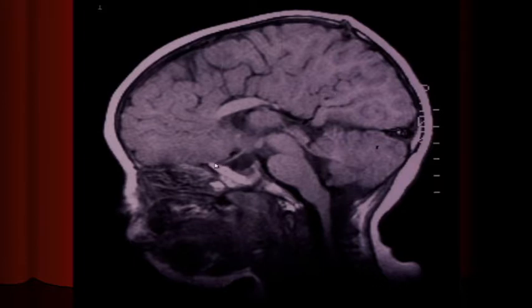The optic nerve. The nerve is from here, and then when it gets behind the chiasm it is the tract. Very good. And what is this right here? The massa intermedia, or the interthalamic adhesion. When you're midline, the thalami are all off midline. This is the massa intermedia, or the interthalamic adhesion.